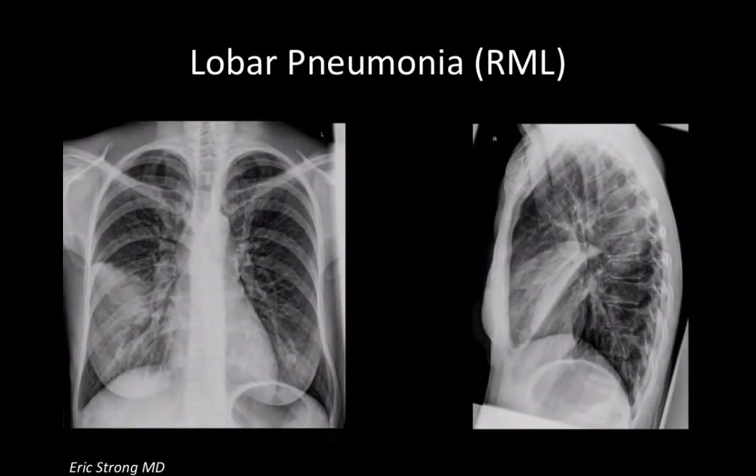Another example of a pneumonia, here a lobar pneumonia, which affects one lobe distribution, is, let's look at the frontal view. There is a pretty sharp margin of an infiltrate, sparing the upper lung field and filling in the lower lung field. I'm saying lower lung field, not lower lobe, just because I'm not sure from the frontal view if this involves the lower lobe or just the middle lobe. Because it spares the diaphragm is still sharp, it's more likely to be middle lobe, lower lung field X-ray abnormality.